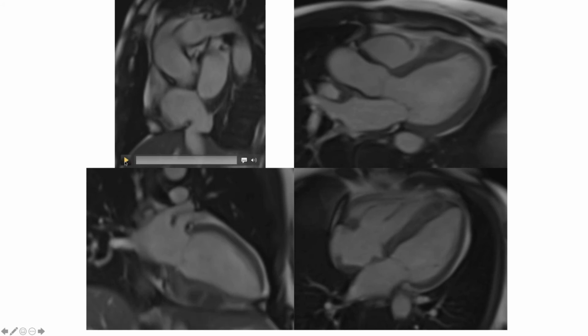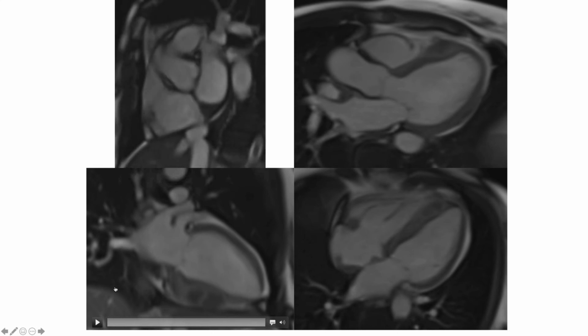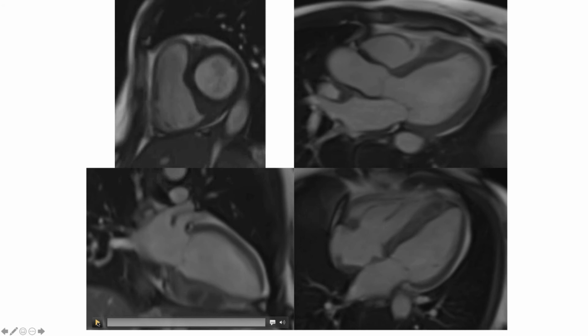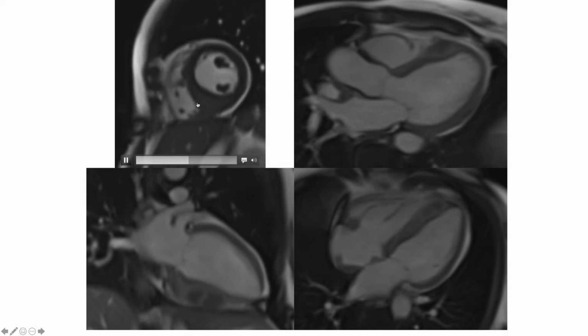And then angiosarcoma is usually more vascular than this, but we always include it in the differential. Lymphoma and angiosarcoma tend to be more right-sided, involving the AV groove. This is not quite in the most common location. Anyone else think of anything else?